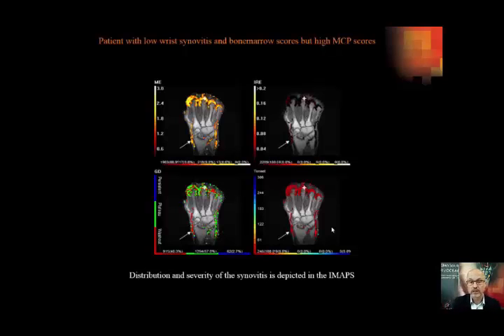And if you do, like we do, usually a coronal view of the hand, then you're also able to assess multiple anatomies from the wrist to the MCP joints, which you are not able to do if you choose an axial view. The axial view will though help you to better separate the tendon sheaths from the synovial lining, but that's what you have to consider when you do your protocol, which are the tissues you would like to address most.